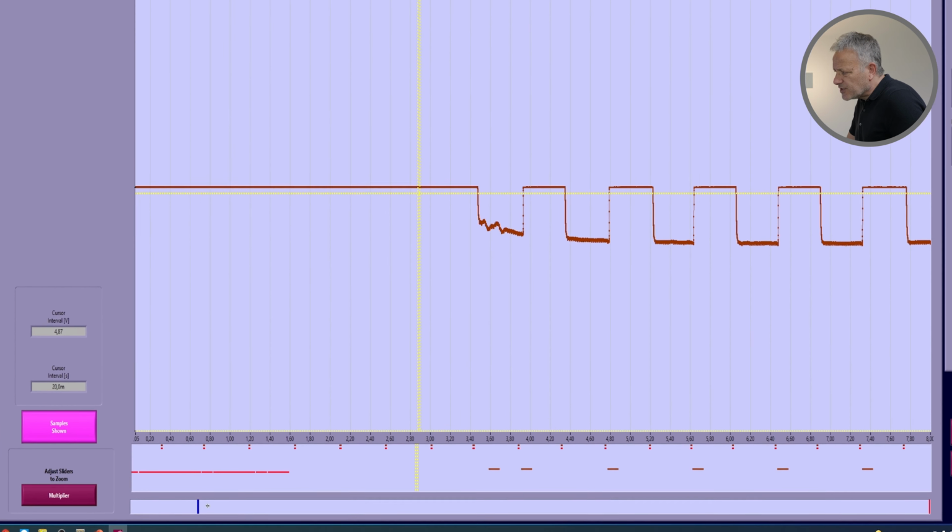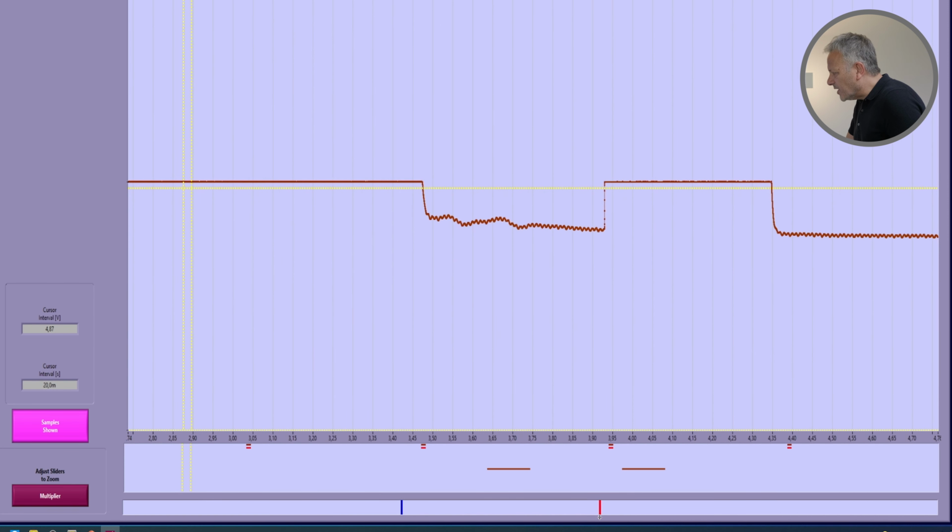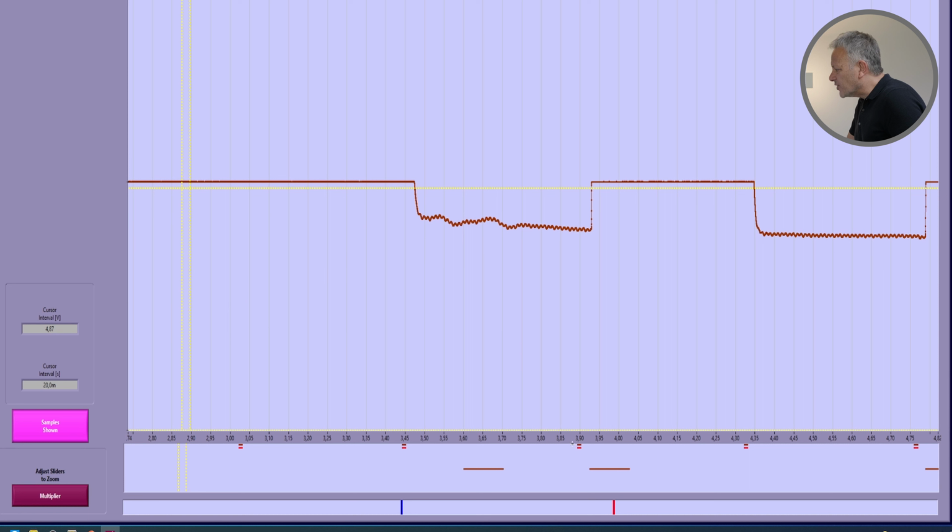So if we stretch those to see the timing for what's happening on the screen and when the trigger is output, we can go about like this, and we can move this trigger and this trigger to the appropriate places. So basically here was the trigger supplied via the ergo one-shot triggering.